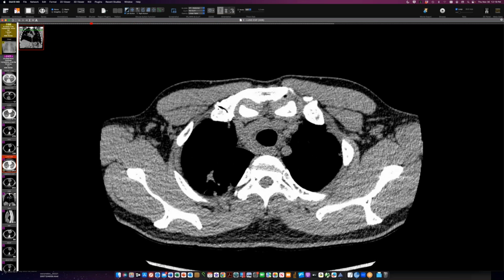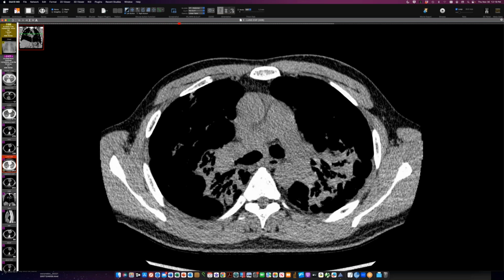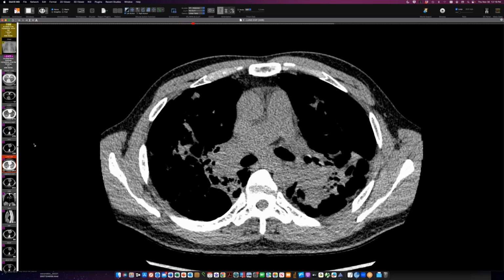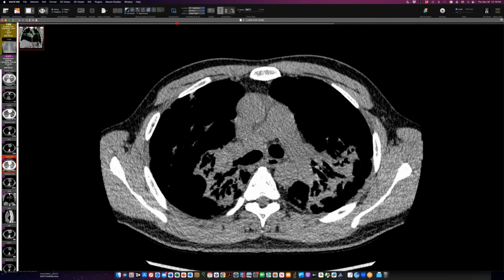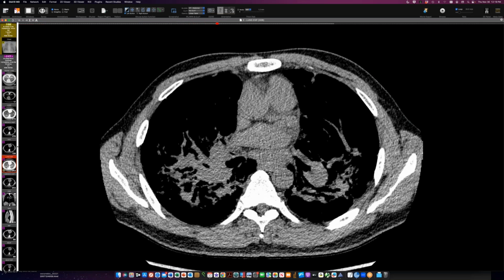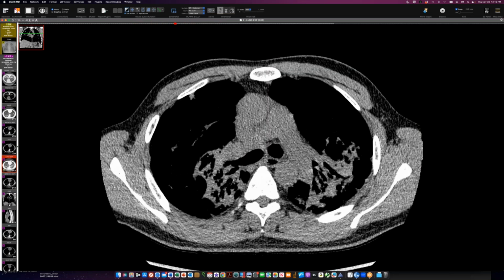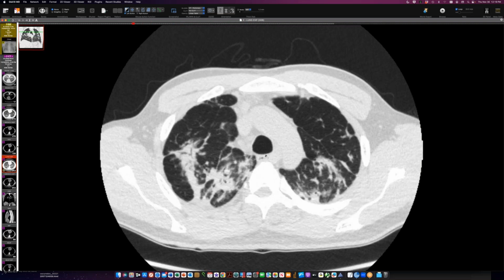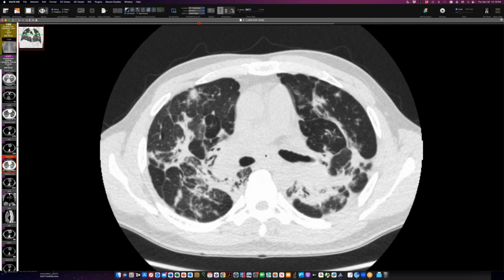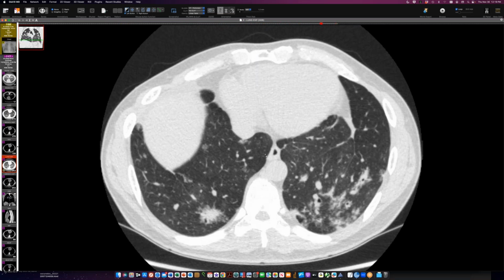There is lymphadenopathy. There are some mediastinal and some hilar nodes, and on some contrast studies, we could see the hilar nodes more clearly against the contrast column. And there's subcarinal lymphadenopathy here, but there's no calcification in the nodes. A lot of calcification might point us again. So the nodes, this could be sarcoid. Person doesn't have a history of documented sarcoid, but really hasn't had a workup of this lung disease.